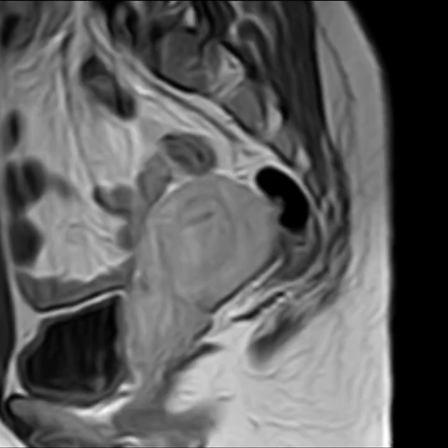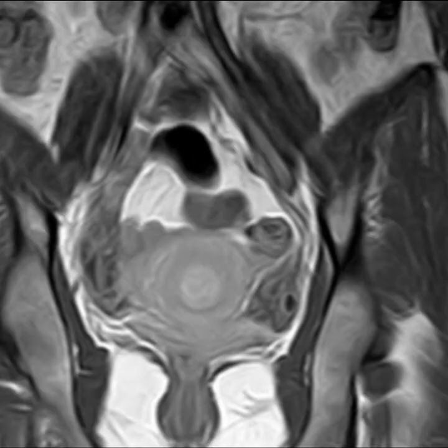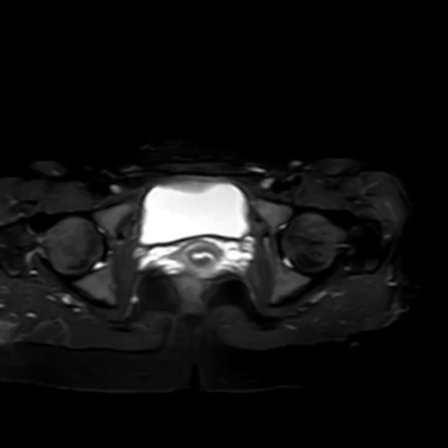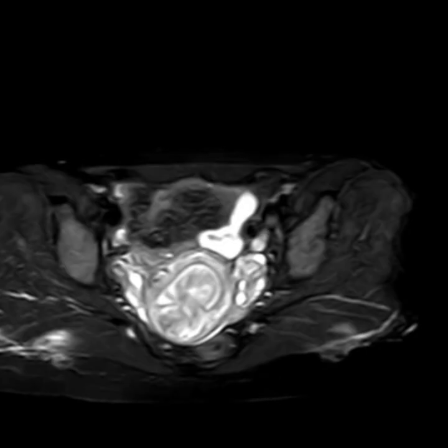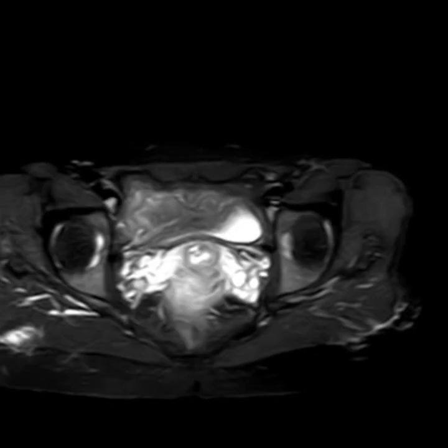I didn't see any signs of invasion or any malignant features. The pelvic fat planes were clear, as we can see here in these T2-weighted fat saturated images. There is no real amount of free fluid in the pelvis.